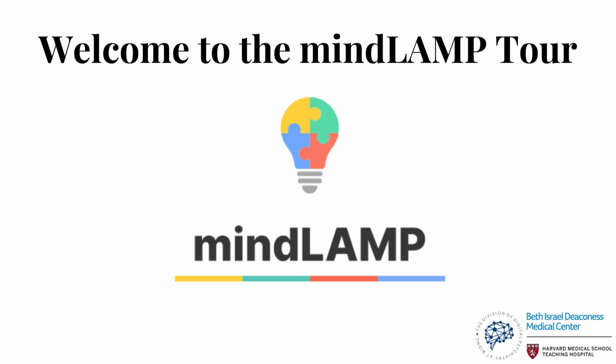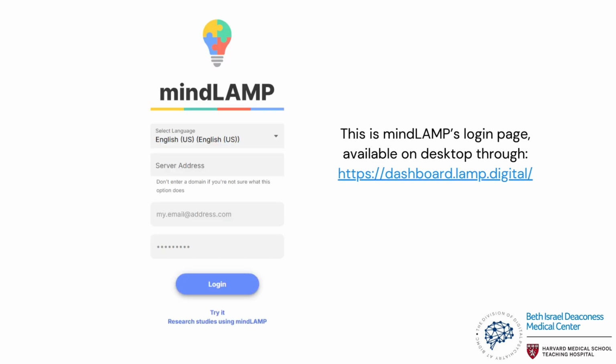This video will cover the introduction to the uses of mindLAMP. This is the mindLAMP login page. It is available on Apple, Android, and the desktop.